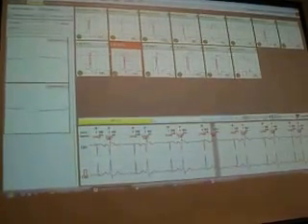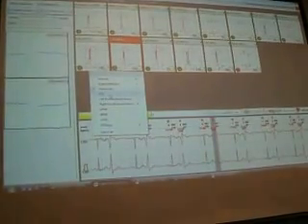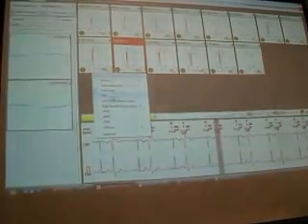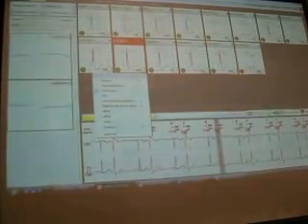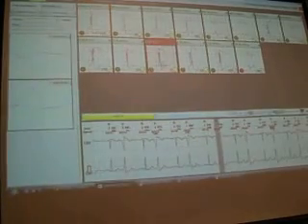And these are questionably rather fusions. It means a junction between the normal and the ventricular, but in this case I leave it ventricular because there are some similar forms named ventricular.